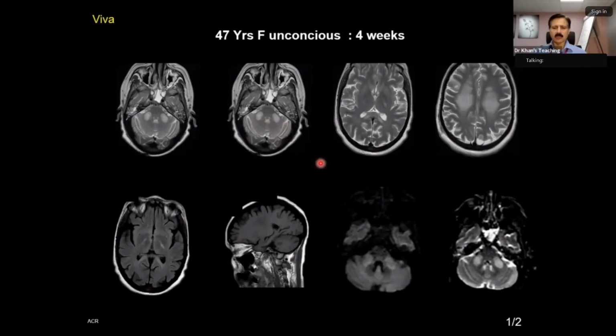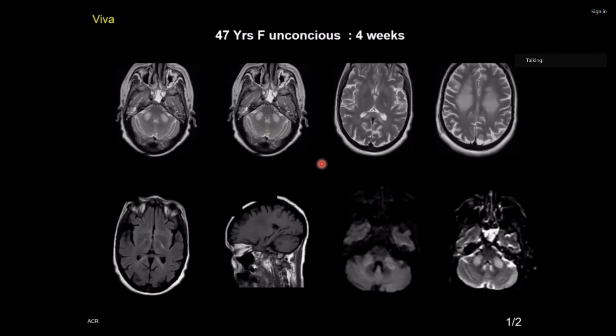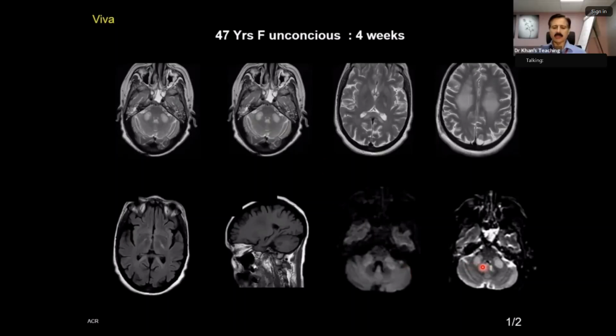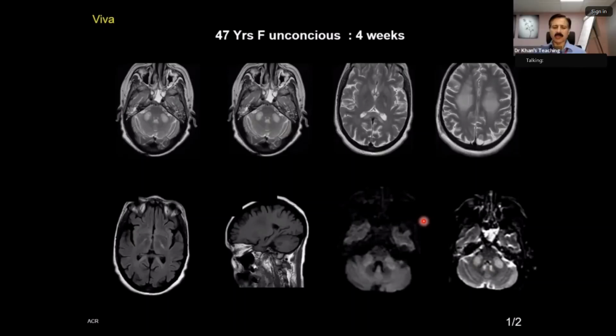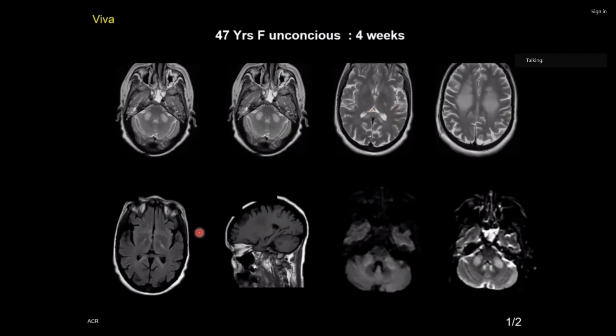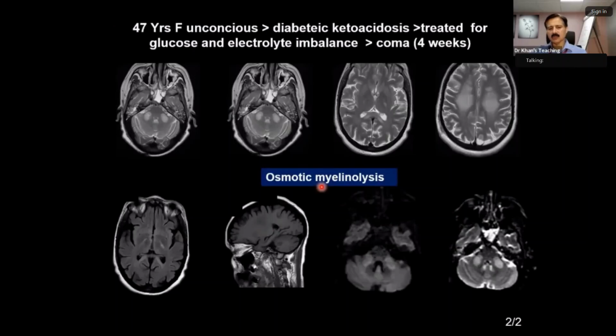Excellent, so middle cerebellar peduncles. And they restrict on DWI in that focused area, bright on DWI and still bright on ADC, but okay, that's T2 shine-through. My question is more anatomy. You have picked up this, and there is the internal capsule. You see this internal capsule? And this thing was actually this.